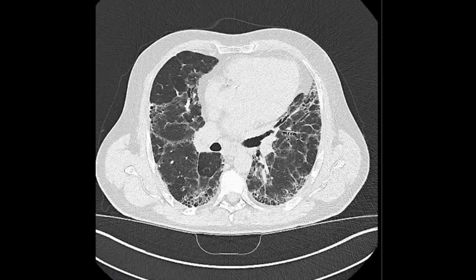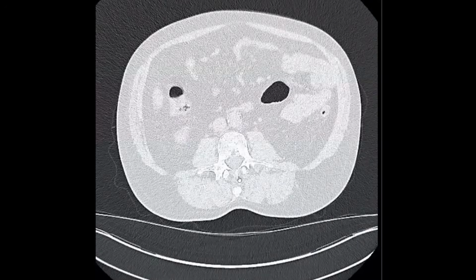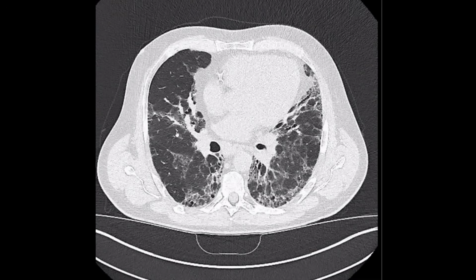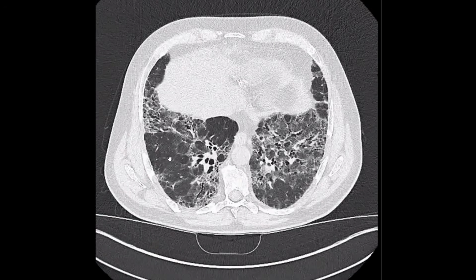Candidate number 7. Can we go to candidate number 8? Yes, sir. This one is the inspiratory phase. Okay. Look for these areas. You should think that we have ground glass, and this one is dark spaces and ground glass again, and sometimes the normal lung tissue in between. Do you know the name of this sign, where we have different densities in the lung? This one is called the three density sign. Okay.